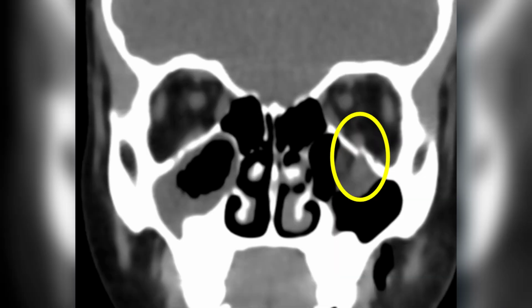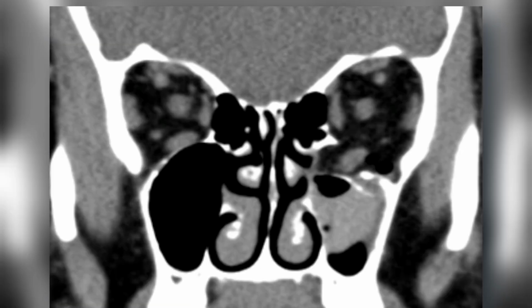Entrapment indicators, particularly in children, include abrupt cutoff of the muscle belly at the fracture site, known as a trapdoor appearance. In these cases, the muscle appears kinked or tented at the fracture margin. Limited upward gaze on clinical examination correlates with radiological findings of muscle tethering. Secondary signs include maxillary sinus opacification due to hemorrhage or edema and preseptal or postseptal orbital swelling.